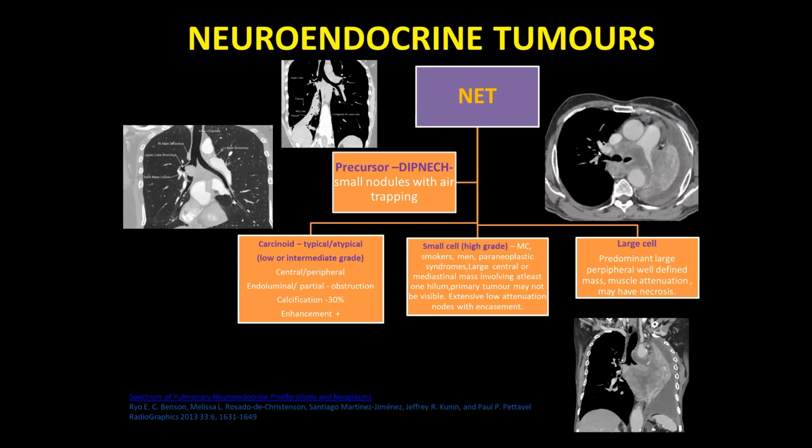Now that produces extensive adenopathy, and you can't see a usual primary lesion or mass, as I told you before. So what happens is the nodes are really low attenuation, confluent, and they spread around the mediastinum, encasing the vessels. And you can see here the pulmonary artery is so narrowed, with no plane with the aorta. In fact, the bronchus was also so narrowed that the lungs started collapsing. So this kind of extensive adenopathy and no discernible mass is encasing and compressing everything.